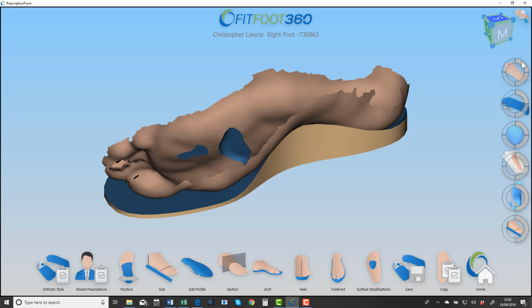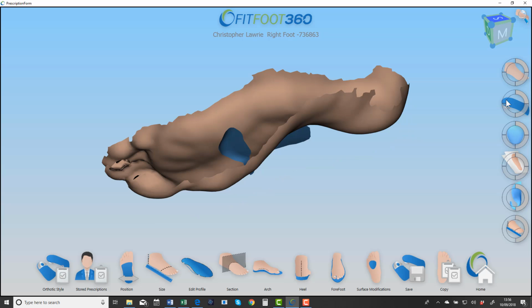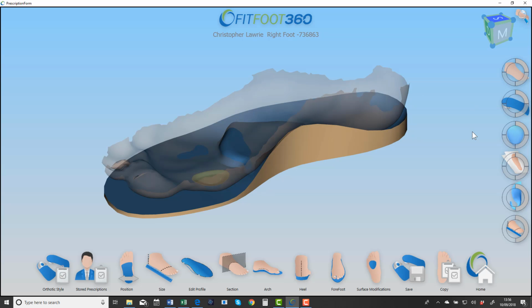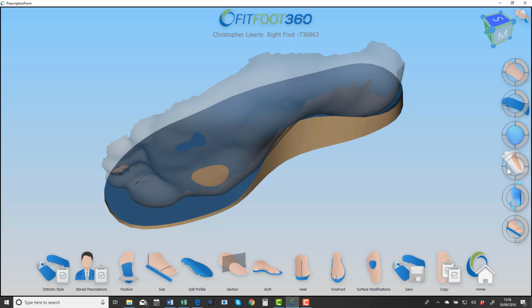That is true of all of the different view controls here. So for example, for our insole, I can switch it to very transparent or off, and likewise with pads, I can turn them to transparent or turn them off. And finally, for cuts and features, trimming, we can turn that off as well.